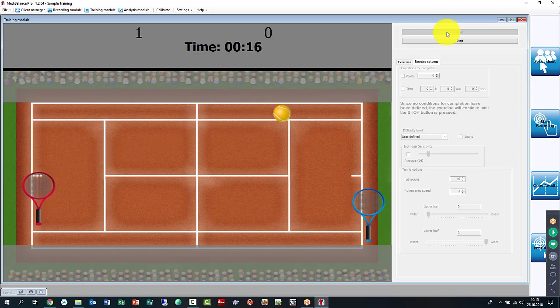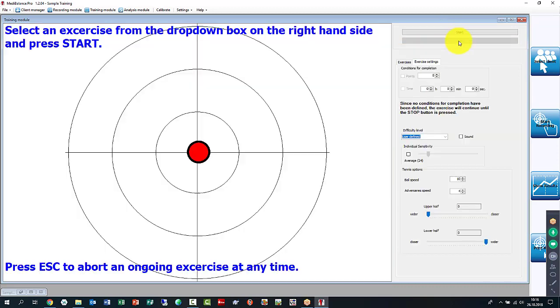And now let's see if I can manage. Now, since I made him slow, I'm ahead by 2. But now he's also quite skilled. And it's actually a challenging game here. So that's how it goes. And before I fall behind, I'll try to score one more or I'll stop it.